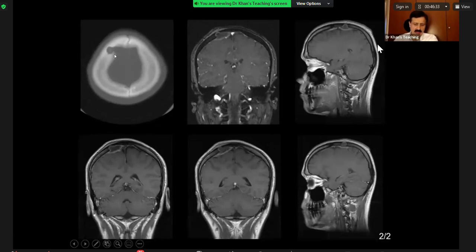And actually what happens is that in Langerhans cell histiocytosis, there is involvement of the meninges. And from there, the lesion can penetrate the skull. And you can see this enhancement, etc. And it can cause this. The concept about a button sequestrum is that they say this is actually avascular necrosis of the central portion of the bone, which appears as a button sequestrum.